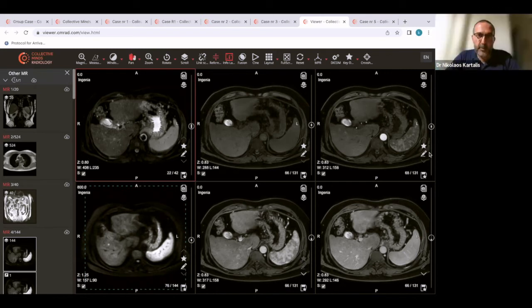Is there any more comment or question, or shall I go through the case? Yeah, you can go to the case, yes. Okay, excellent. So this patient, as said, has cirrhosis, and there were limited views on the liver because of habitus. So we have the patient doing the extracellular enhanced MR. Again, T2, diffusion, dynamics on the right-hand side.